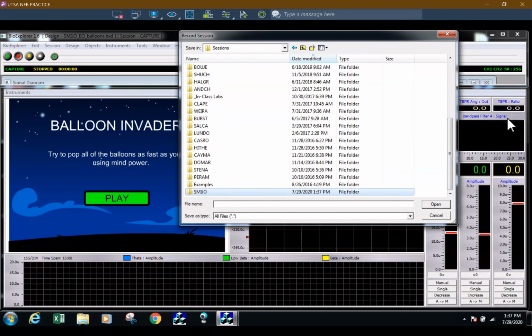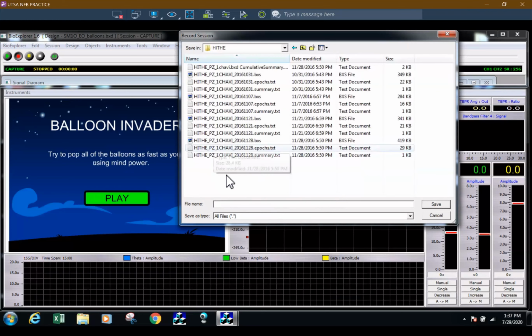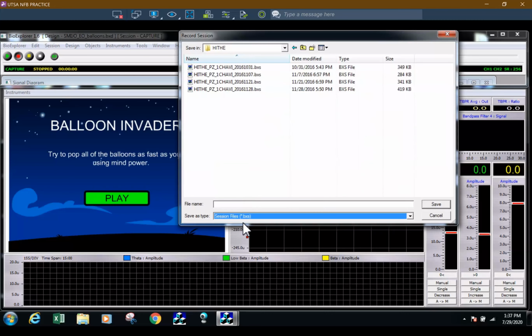And so every session, you're going to record the session and you're going to put it in their sessions file. Let me show you an example of a previous client, what this will end up looking like. Let's open his key. So disregarding these text files, let's just look at the session files. So this also shows us how we'd like for you to name your session files.